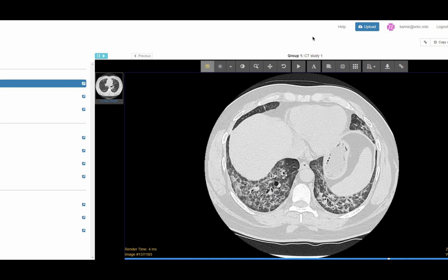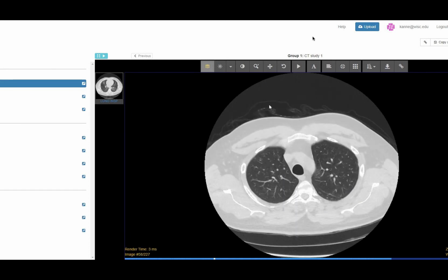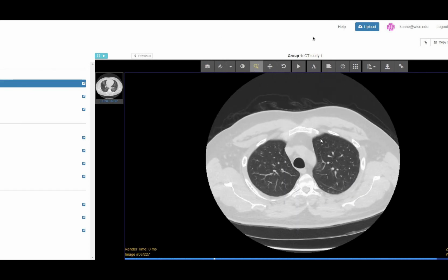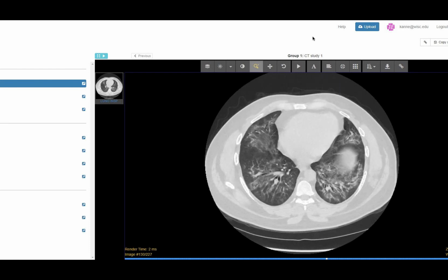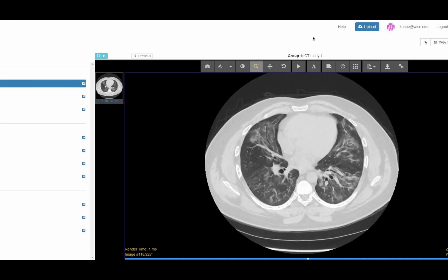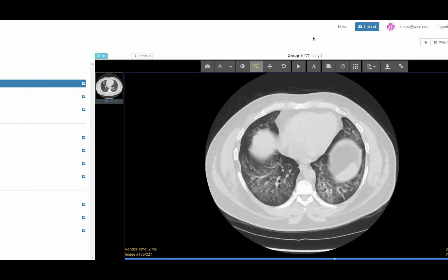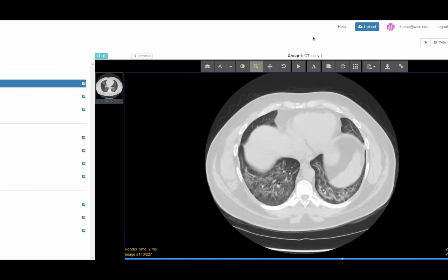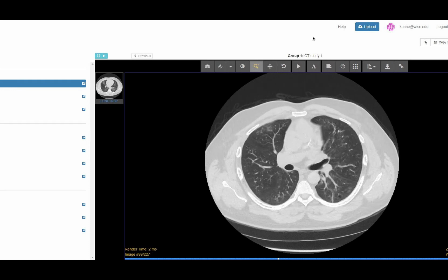And then this was the most recent scan, and I think this was one of ours. I'll make it a little bigger here. Anyway, it has evolved into an NSIP-like look. We've seen this before. It's been well described: as the lung injury heals and the epithelium regrows, the collagen in the airspace gets incorporated in there. And I think it's going to stabilize at this point because there's not an acute lung injury.